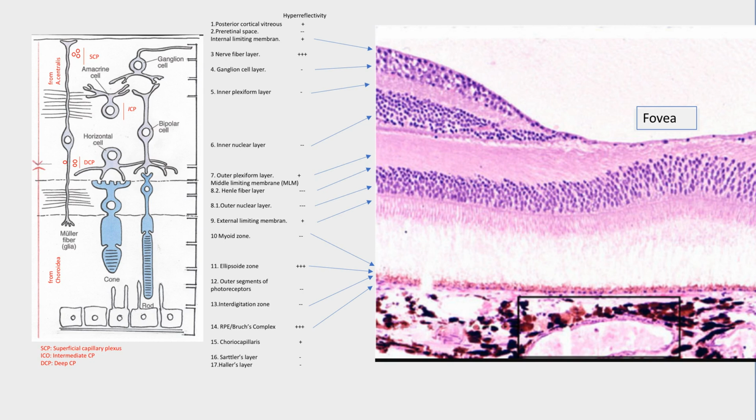In the macular region, there are no rods, but only cones, with a density such that the outer nuclear layer reaches its maximum thickness. The outer limiting membrane, in the absence of the other layers in the central area, forms a sort of depression called fovea externa. The layers of the inner retina reappear more laterally, welcoming the nerve fibers of the cones.